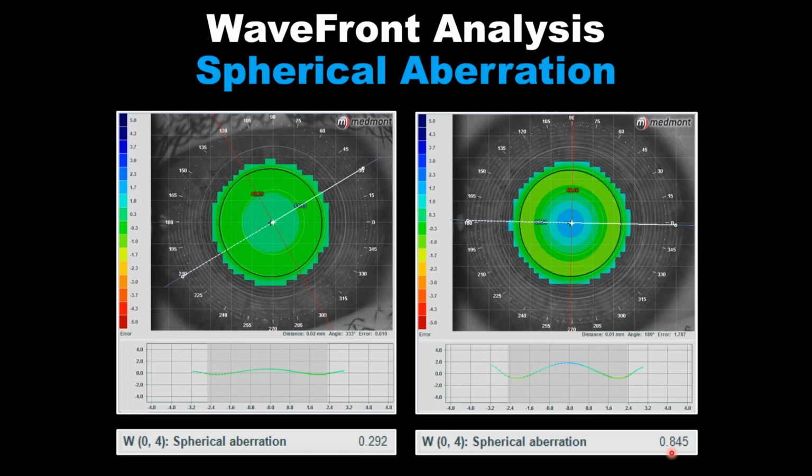We need to customize our ortho-K for each individual eye. But let's agree that increasing spherical aberration is what we want to do. And the more we increase this value, the better. So more research needs to be done to understand that absolute shift, or let's call it the average shift that we should see in most eyes.